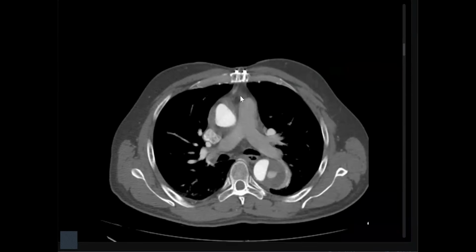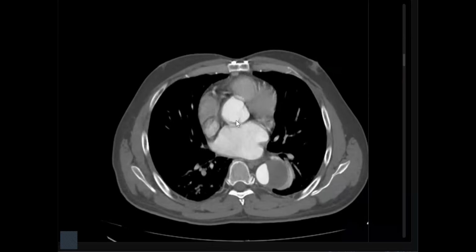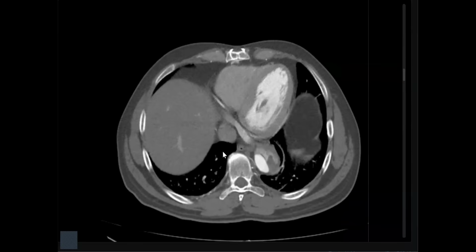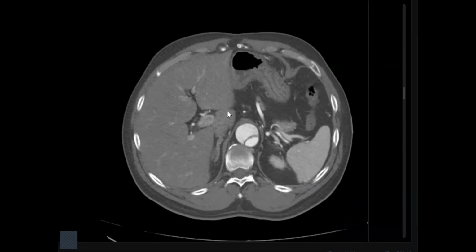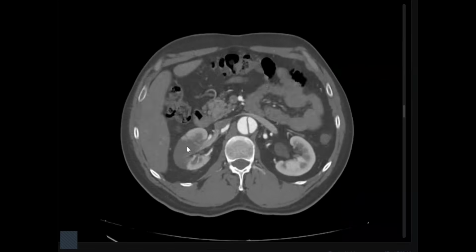Complications: very important to mention if there is a mediastinal hematoma or not. It's a pertinent negative. You didn't mention this point. So no significant mediastinal hematoma, no significant pleural effusion or pericardial effusion. These are local complications in the chest. What about other complications regarding the extension? Here, very good, you detected infarctions.